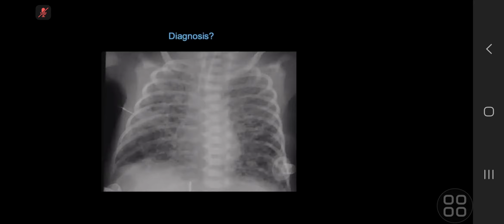So this is a frontal radiograph of a child. There's an ET tube which appears to be in satisfactory position, and there's also a tip of a tube arising from the abdomen in the right upper quadrant.